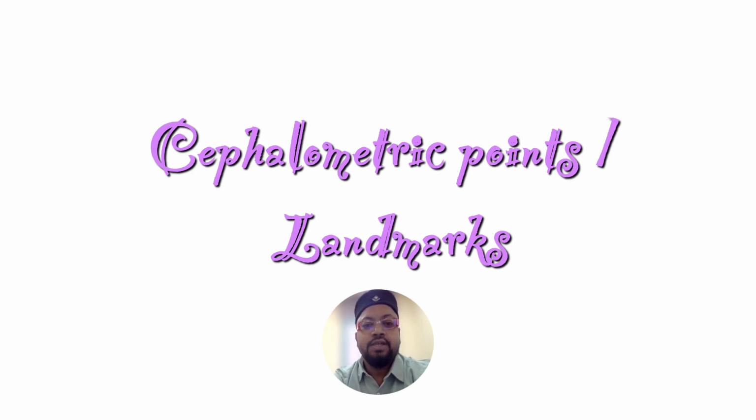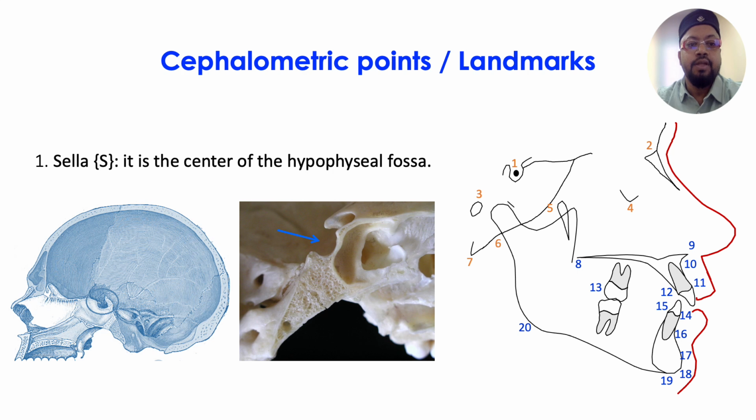In this lecture, we will learn about cephalometric points and landmarks, mainly the anatomical landmarks of hard tissue and soft tissues. The first landmark is sella. It is the center of the hypophyseal fossa. You can see in the picture the number 1, the central dot in the hypophyseal fossa is the sella.